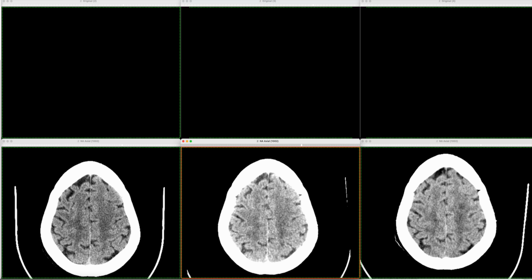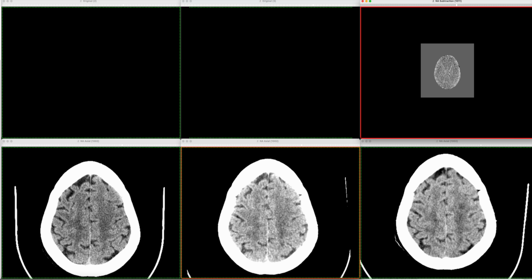What I'm now going to do is show you an additional series that we are able to do because we co-registered the images. We can do a subtraction series. And the subtraction series is always the new minus the old study. And basically what it does is it allows you to subtract the Hounsfield units on a pixel by pixel basis such that you're doing new minus the old. And so if you have a new area that's lower density than it used to be, when you subtract, you get a negative number or a dark area.